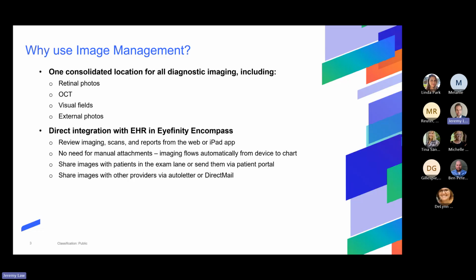And of course, you can do that on the web application as well, show it on the big screen, whatever your preference is. But you're also able to download the images from image management, send them via intramail to the patient's portal. Patients, I'm sure you've all heard, a lot of times will ask, hey, can I get a copy of my fundus photos, for example? So we make that easy to do with image management.